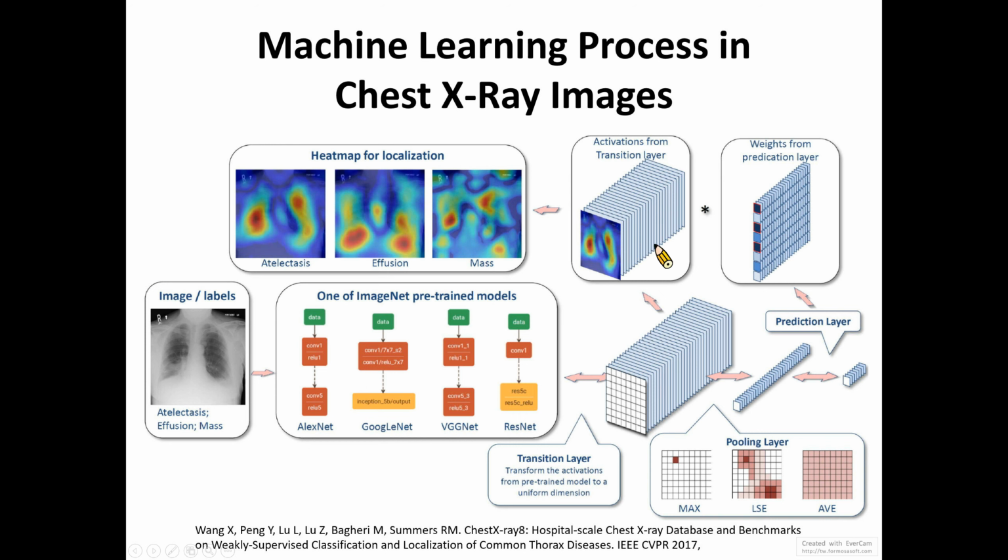Okay, then we will resize the images with this command and assign the data to augmented image IMDS validations. Then we just give the neural network some default parameters. Then we can train these neural network models. Then it should pop up the training window very soon.